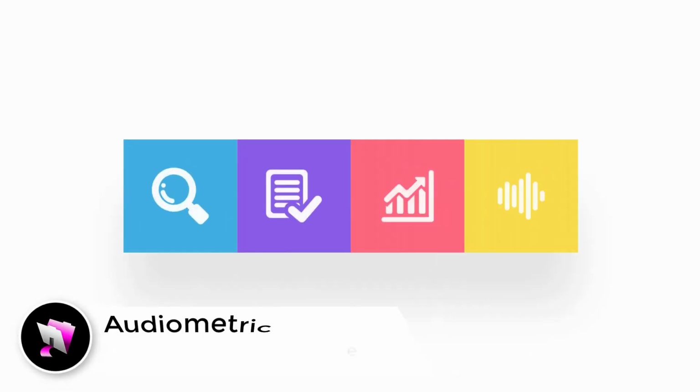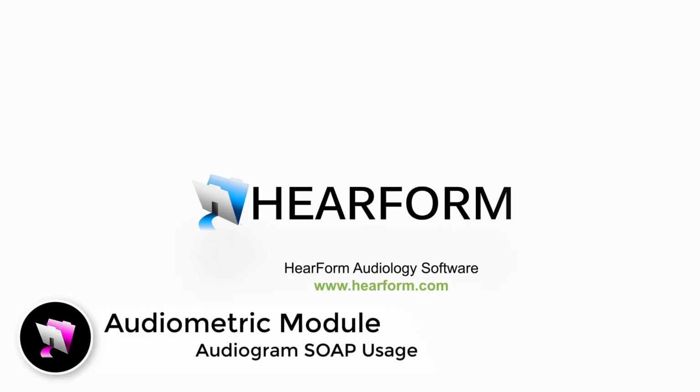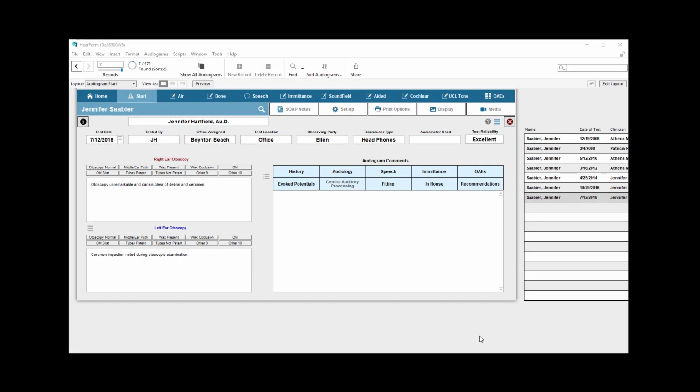Welcome back. This video will explain how to use the Soap Notes reporting module. Okay, well, I've given an overview of the Soap Notes area. Let's go ahead and start using it and see how it works in real life.